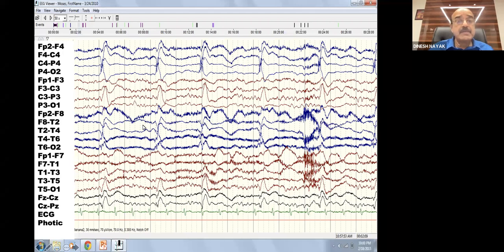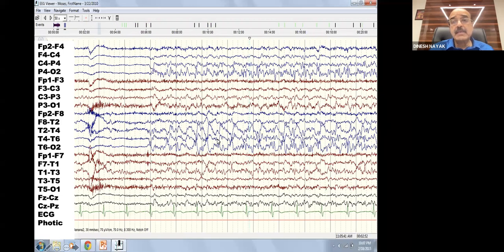You see the next page, and it has resulted in a clinical seizure, an electrographic seizure becoming clinical. That is a very nice evolution, only seen on the right side, in the right hemisphere, predominantly over the occipital, parietal, temporal region. Very nicely evolving rhythm. So PLEDS plus results in clinical seizures. PLEDS proper, that means without after discharges, generally does not result in clinical seizures. That is a very important take-home point.